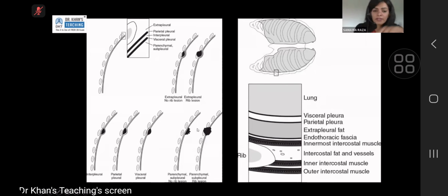So the take-home message is a peripheral lesion that is irregular on the lung side is likely sitting in the lung. The thing to look for in that situation is extrapleural fat. If you see clean extrapleural fat, you are reassured. If this was malignant, you have to assume this has involved the visceral pleura. That is okay. What this clearly shows is that this has breached into the extrapleural space, and in this case has actually gone into the intercostal muscles and is involving the chest wall. So both of these situations upstage the disease if this is cancer.